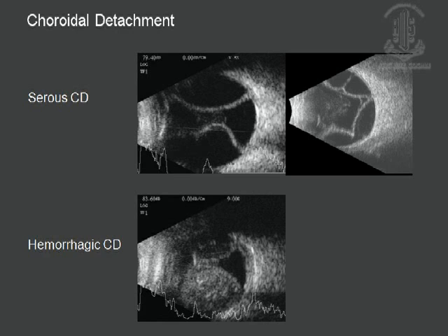You always have this kind of a detachment. Sometimes you see a band stretching across the suprachoroidal space. This is believed to be the vortex veins which are stretched out. One way of diagnosing choroidal detachment is to do the ultrasound, keep the probe extremely anterior, and take a transverse section anteriorly. You see this kind of a scalloped appearance here, as you see in one of the slides.